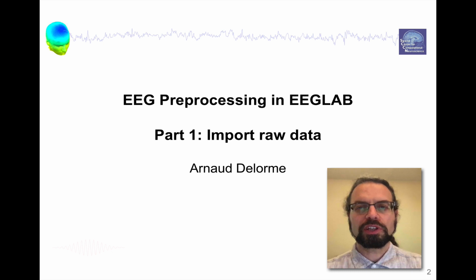So in this series of videos, I'm going to show you how to pre-process data in EEGLAB. And the first step is to import your data into EEGLAB.